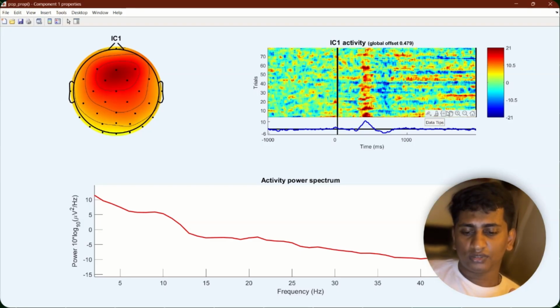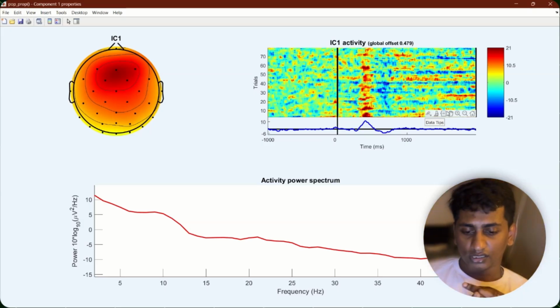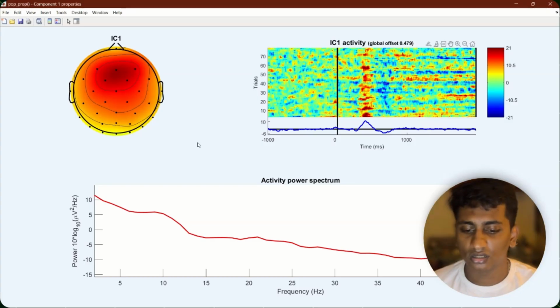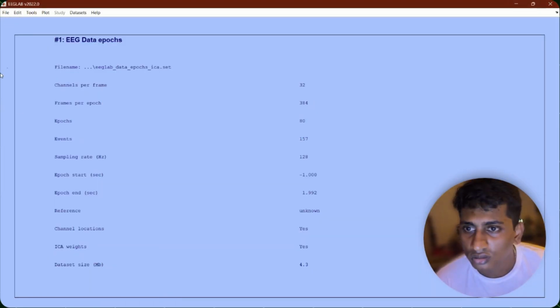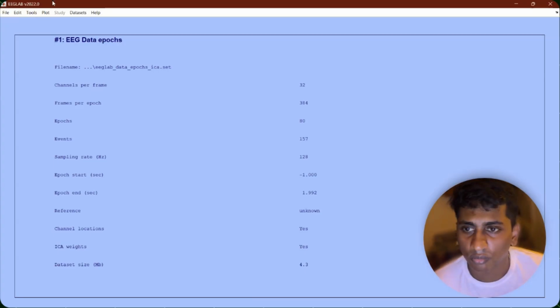To get the exact steps, in EEGLAB you can go to topoplot, and you can fix a grid scale like 64 by 64 or anything like that. In this, the image processing also will create a proper output. We have already studied the power spectral density analysis and component mapping. We'll go for the ERP image components.